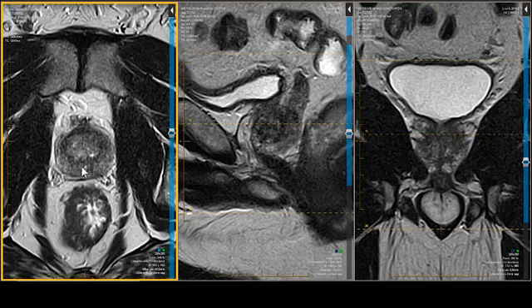And the peripheral zone has no masses. Granted, it is a little dark, so that would give it a score of 2. The transitional zone has probably a score of 1 or 2. It's a little bit heterogeneous, but not much. So I would give it a score of 1. These dots I probably would ignore.